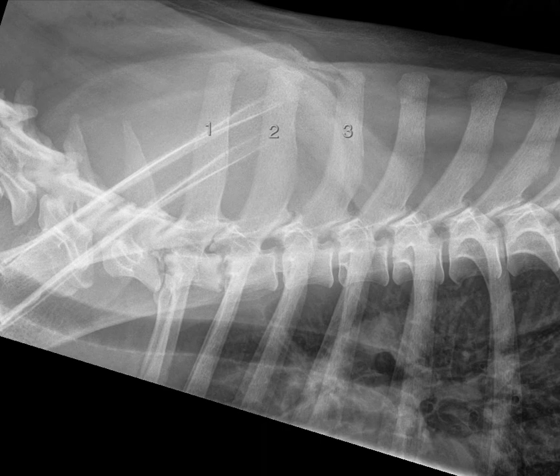I'm Heather. Here is a 5-year-old female spayed German Shepherd dog. She presented with chronic low-grade forelimb lameness. Once you've reviewed the radiographs using a systematic approach, then you're ready to watch this video. Now, let's start with the lateral view of the vertebral column.